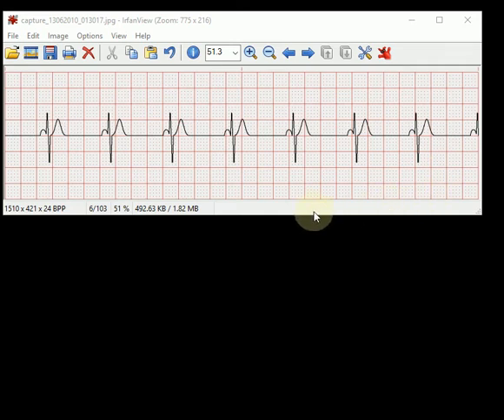Take a look at the QRS. Is the QRS wide or narrow? And I'm going to ask you at each one of these junctions, feel free to pause the video so that you can figure out your answer first, and then I'll just jump right in and answer it. So first off, determine, is the QRS wide or is it narrow? Go ahead and pause and determine your answer and then come back. Okay, well the QRS here is only about one small block wide, so it's certainly narrow.